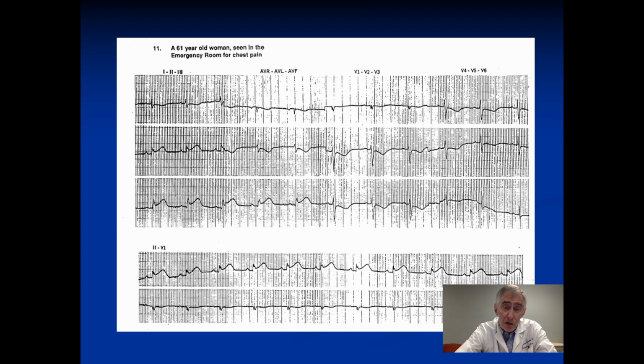So there, now you have the end of the EKG. Have fun with those other tracings. Try and remember, 1, be systematic. 2, clinical context. 3, find an old EKG, which you don't have with all of them. And then watch out for bad data. And you'll have plenty of help with your instructors.